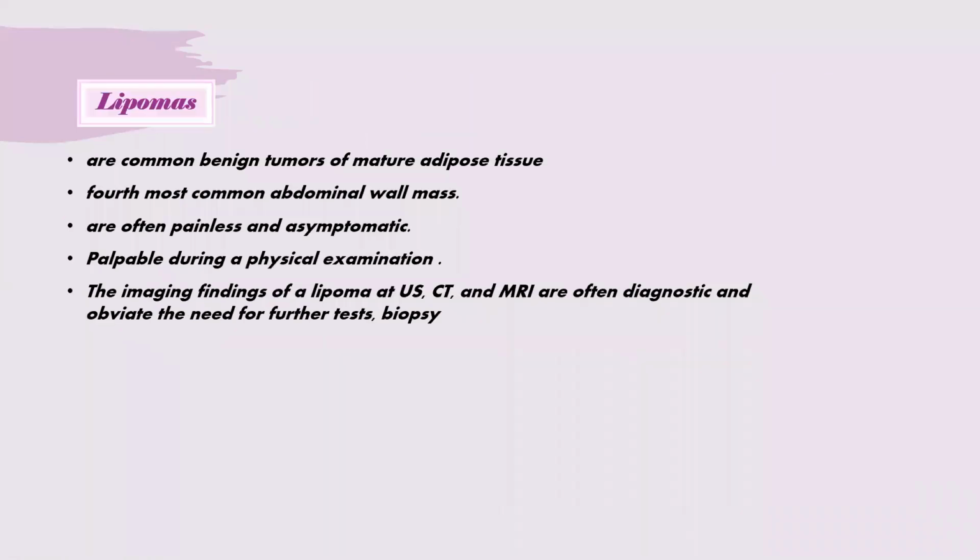Lipomas are common benign tumors of mature adipose tissue, the fourth most common abdominal wall mass, and are often painless and asymptomatic. Palpable during physical examination, imaging findings of lipoma at ultrasound, CT, and MRI are often diagnostic and obviate the need for further tests like biopsy.